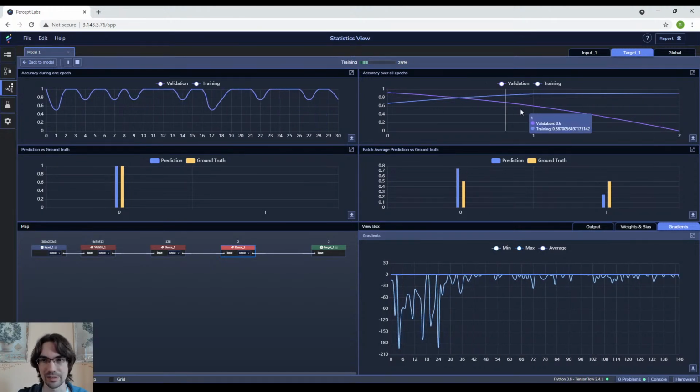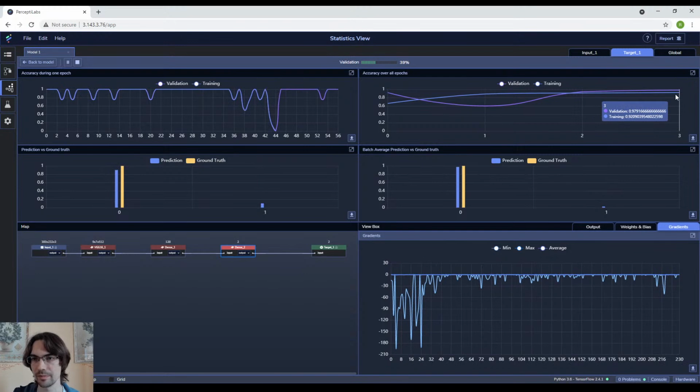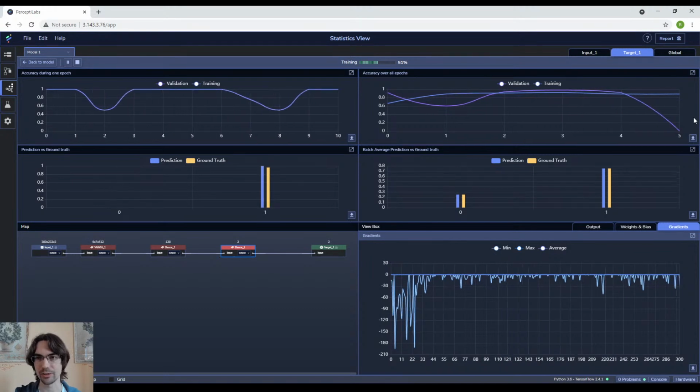Well, we saw the last MobileNets dipping down a bit as well, oscillating on the accuracy, which is curious. If we wanted to optimize on validation, training, we'd probably stop here. But let's see if it keeps that up for the 10 epochs, or if it starts dropping down.